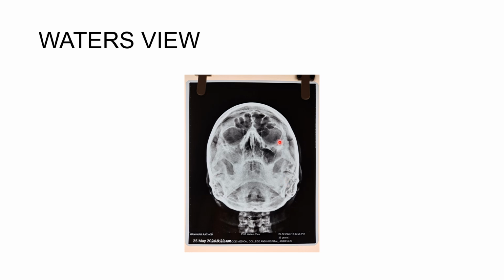the neck, as you can see, is tilted to about 45 degrees. Why is this done? To see the maxillary air sinus properly. This is the view in which you can see the maximum exposure of the maxillary air sinuses, and other air sinuses like the frontal, ethmoid, and sphenoid can also be seen. The sphenoid will lie just behind this.